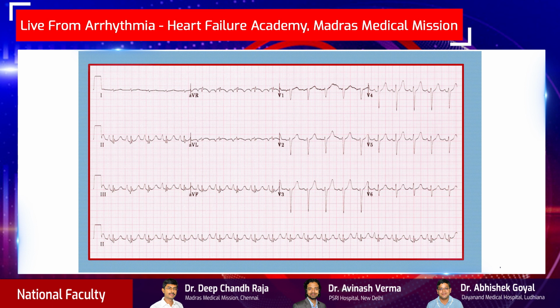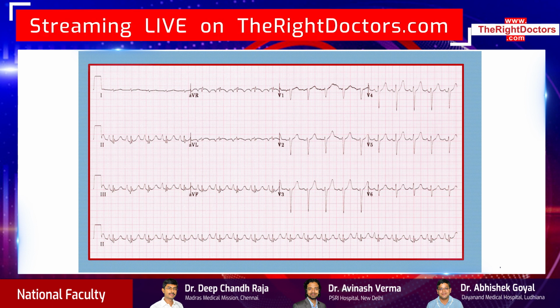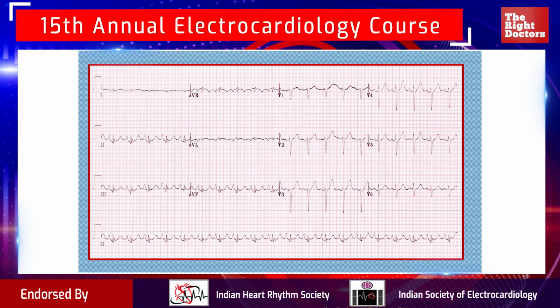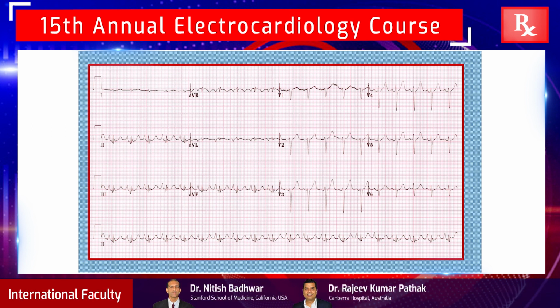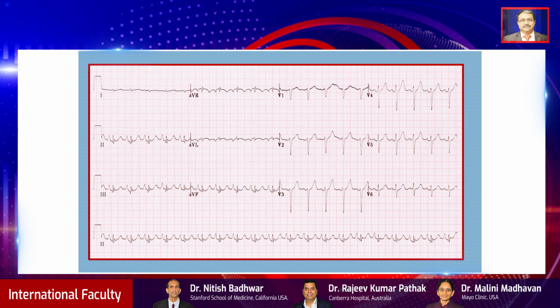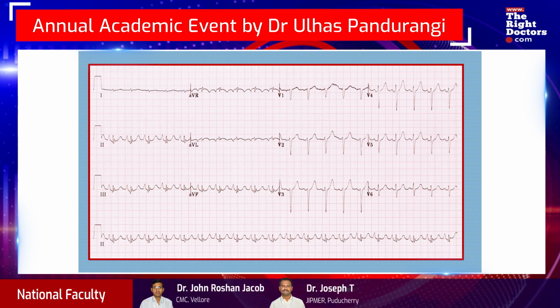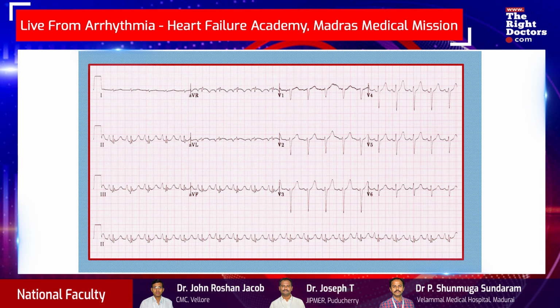So in this ECG, what you can pick out initially is a low voltage complex, it looks like lead 1, but it's extremely low voltage in lead 1. In lead 2, you can see the markedly enlarged, peaked and tall P waves suggesting right atrial enlargement. The P wave axis is again rightward. So rightward P wave axis, right atrial enlargement. You can see the R wave progression. Again, that's poor R wave progression. You barely see any, that's a late transition of the R waves.